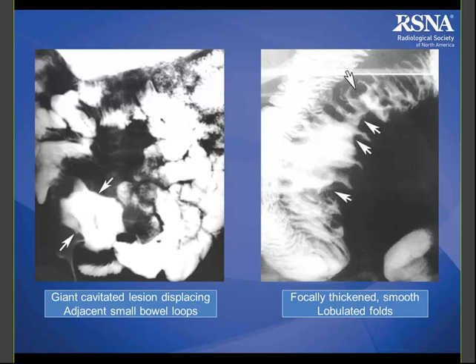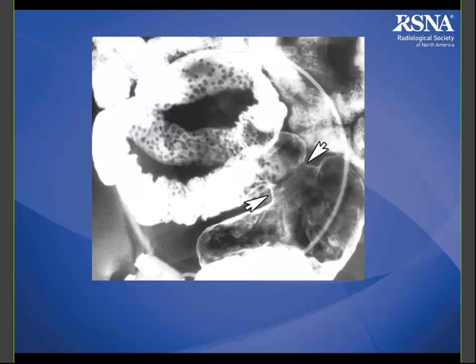These were both cases of lymphoma, but can be very hard to tell, obviously, if you don't have some history to help you out with that. This is showing a number of small intraluminal filling defects, multiple small bowel nodules, and an area that's narrowed there as well, with suspicion that there's a dilated portion of bowel adjacent to it.